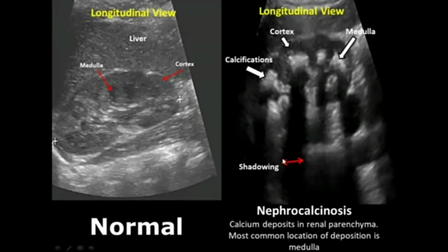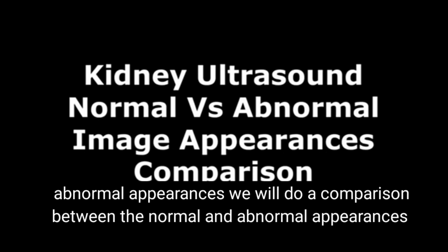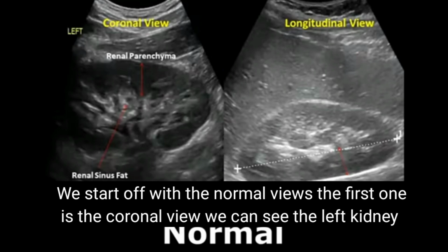Hello everyone, it's Dr. Teba and today we will talk about the kidney ultrasound, normal versus abnormal appearances. We will do a comparison between the normal and abnormal appearances. We start off with the normal views.